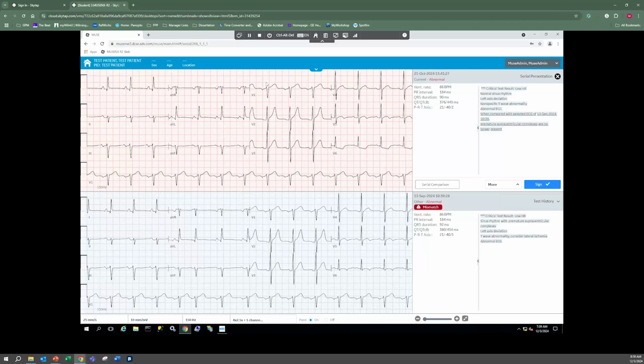Oh, okay, yes, super. Absolutely, great, thank you. So physicians in Germany write like SR, like sinus rhythm, heart frequency 65, left type, and then no repolarization problems, also like that. In one line, comma separated, because when you take it over into the discharge summary, you don't have to delete the carriage returns and so on.